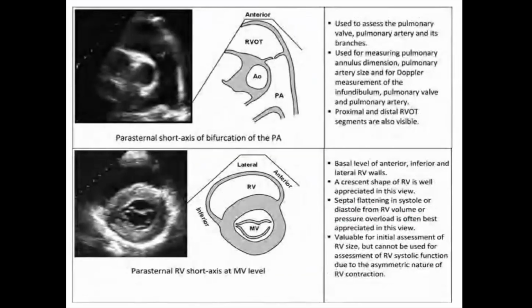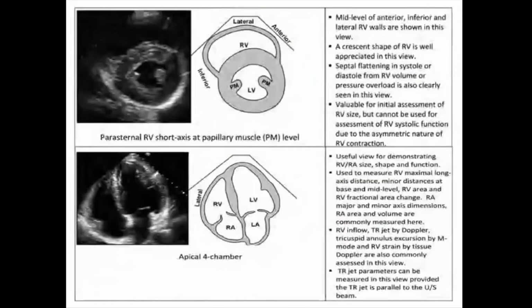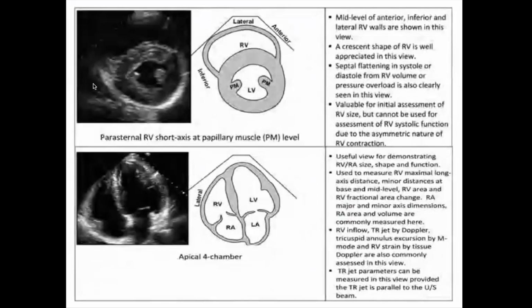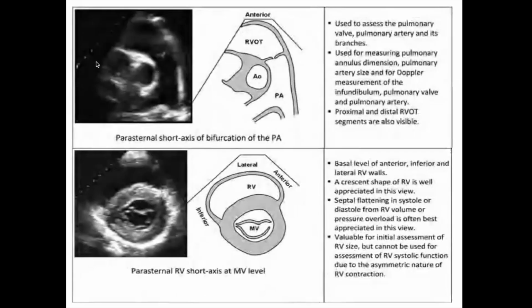Basically, it's the inferior septum when you have an inferior infarction or RCA infarction. Yeah, they're close to that. So it's the inferior septum, and then the inferior wall. Usually it's closer to the mitral valve, the basal inferior. Yeah, the bottom one. And then right there, the inferior portion of the RV. You can circle that on the screen. It looks like a T upside down. But if you are from Yale University, it will be the Y sign. It actually looks like a Y as well, as in youth.